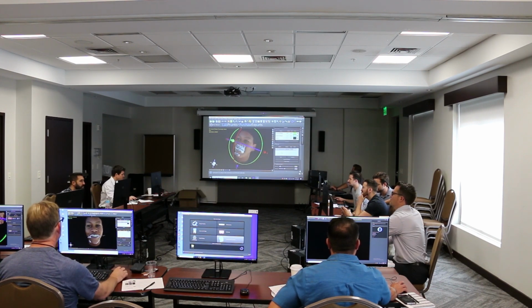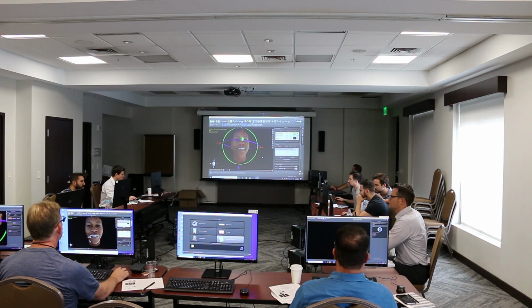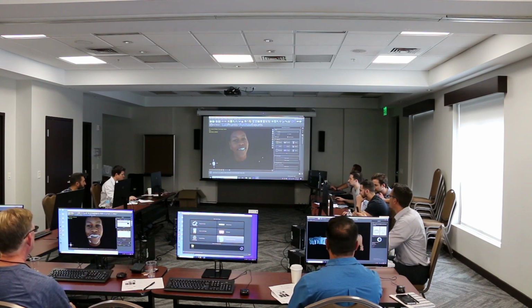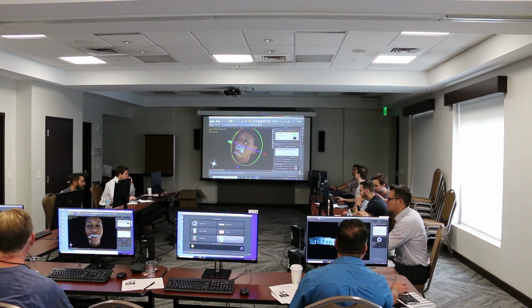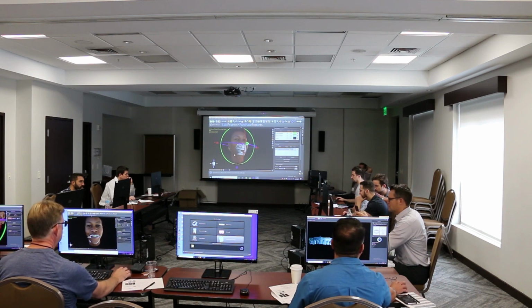Does everyone understand that concept of using the DICOM data? Because now after I use that, look, I'm getting closer here, right? Things are starting to line up, though I'm still a little canted here. It's challenging to do. And that's why if we have more DICOM data, it'll be easier. If your scanner scans up near the orbit, you'll get the nose and the eyes to use as better reference points.